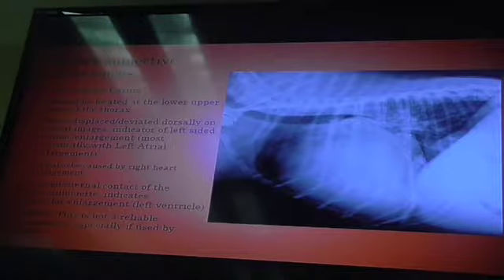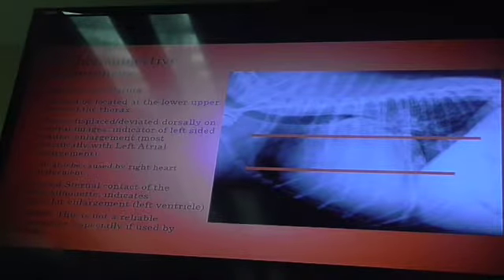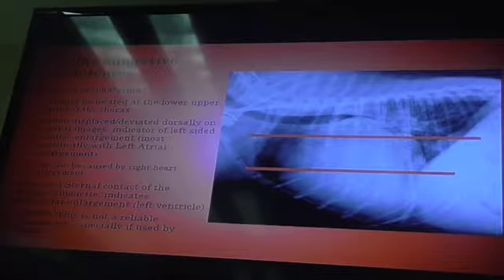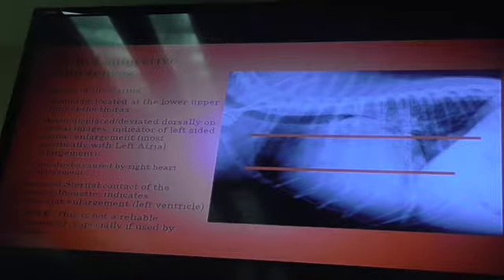All right. So other subjective changes, and since this thing takes forever. So remember I talked about the carina. That's another quick assessment. Okay. When we talk about the carina, we split in our heads this thorax into 3 equal parts. The carina should live somewhere near this bar on the lower upper third. That sounds backwards, but lower upper third of the thorax. That's how we should see that nice rounded lucency as we get ready to do the bifurcation, right? But on this one, you see it's displaced dorsally. Primary cause of that? Left atrial disease. Okay? Dorsal displacement of the carina, left atrium.